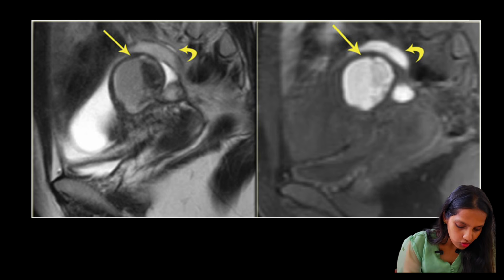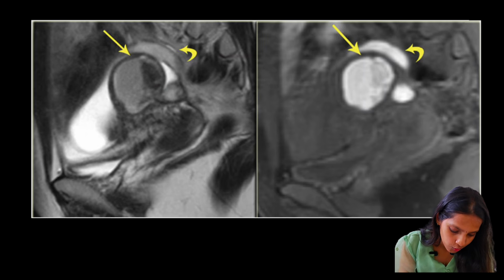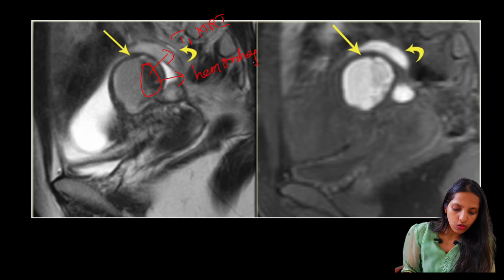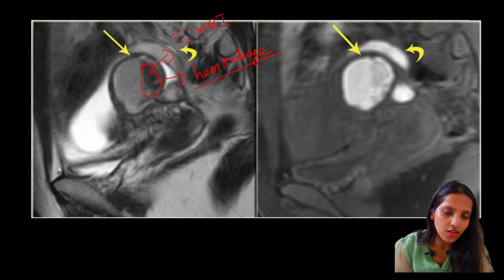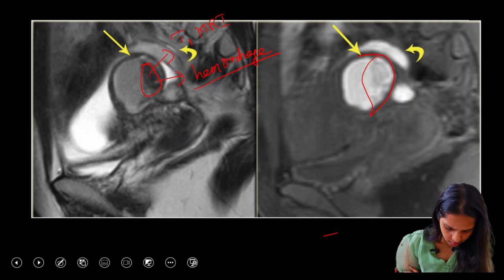And in this image, this is the sagittal section of the MRI pelvis showing hemorrhage. That's the T1 MRI showing a hyperintense content. That's the hemorrhage. So whenever an image shows T1 hyperintensity in the cyst, that shows the hemorrhagic component. Here we can see it even more.